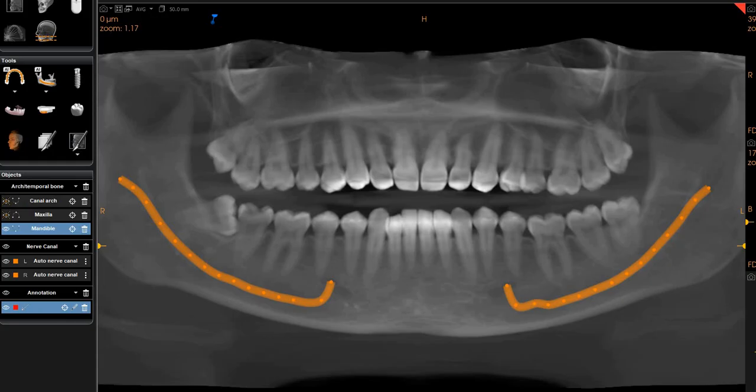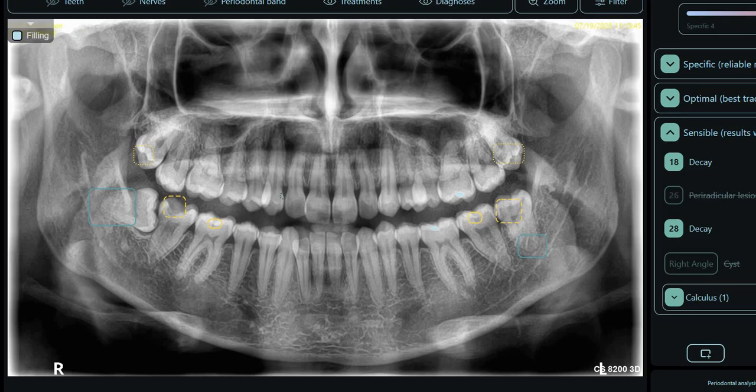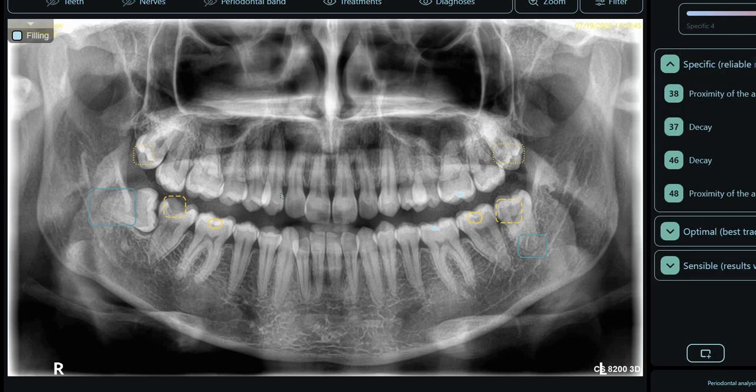So even though this was approximately 98% correct, there were only two or three areas where the report was not as accurate as we would have expected it to be. But the good thing is, the AI detected four absolutely specific things which it thought it was completely correct about, and those were the four specific things that the AI thought it had seen.